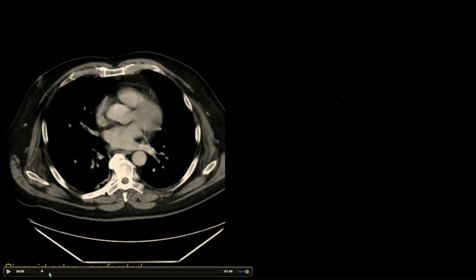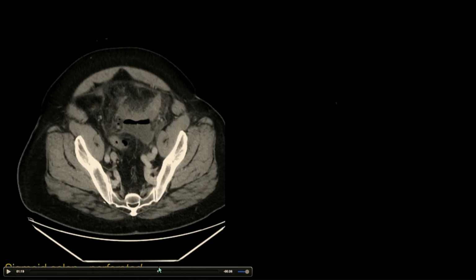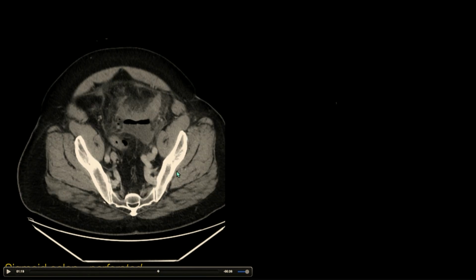All right, we're now getting on to some complicated versions of diverticulitis. This is a perforated diverticulitis of the sigmoid colon. And you're going to find a variety of appearances. It really depends, especially if you're dealing with immunocompromised patients, you might have a perforation that spreads and goes way farther than you'd think.